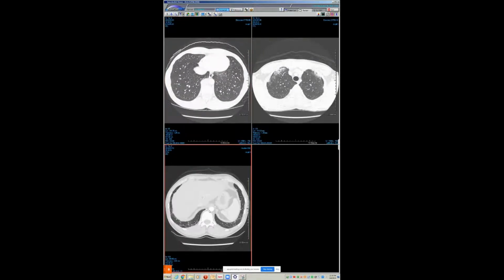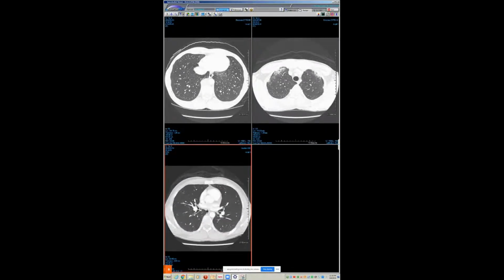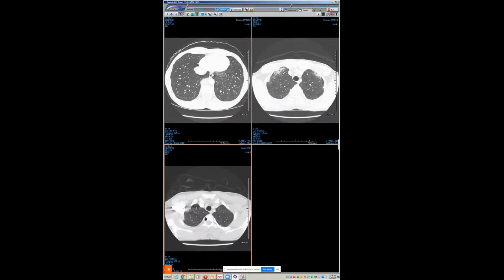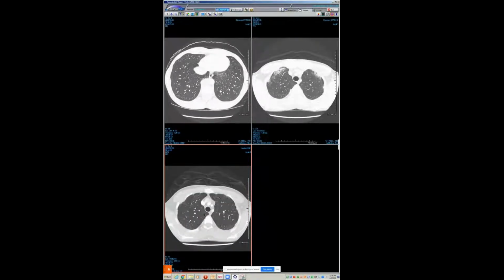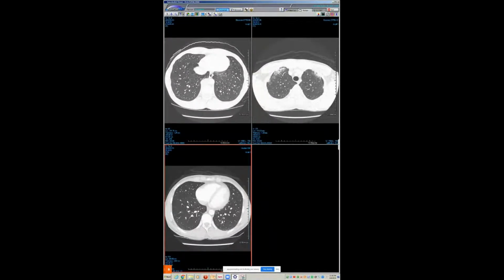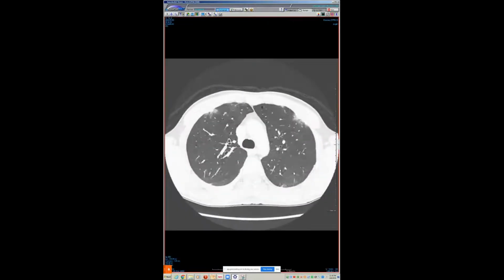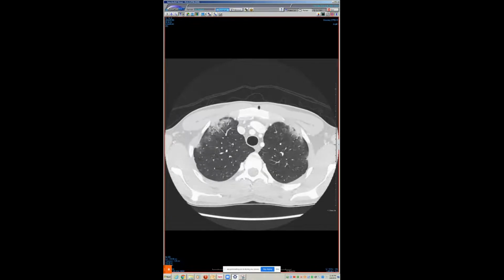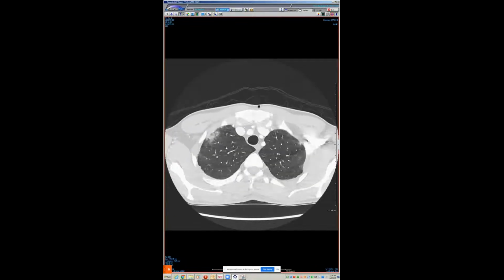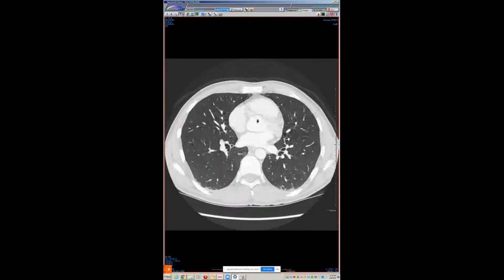Whenever you see fibrosis in a young guy, you're not thinking one of our most typical causes of UIP or something, or even NSIP in a young guy. I think he might have been in his 20s. So I always, when I see this pattern, think there's some sort of prior lung injury. And then went back and found this CT from about 4 years prior, about July 2016.